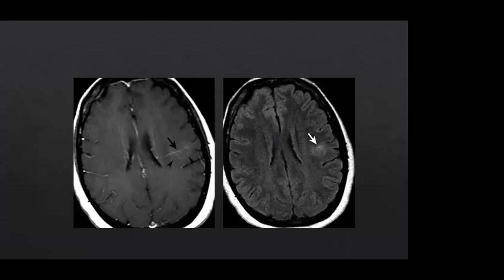And sometimes they can cause pathology, especially if they get thrombosed. Like in this example over here, you can see the developmental venous anomaly, and some of the tributaries were thrombosed, giving rise to venous hypertension. They can develop stenosis as well, and that can cause venous hypertension within them and can cause calcification as well. So this is what a developmental venous anomaly looks like.